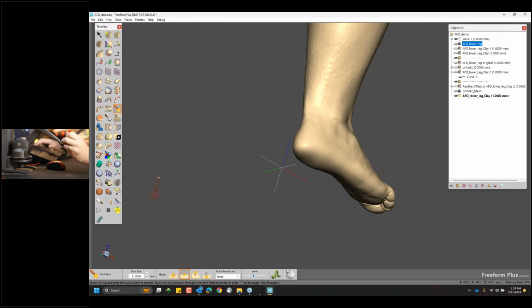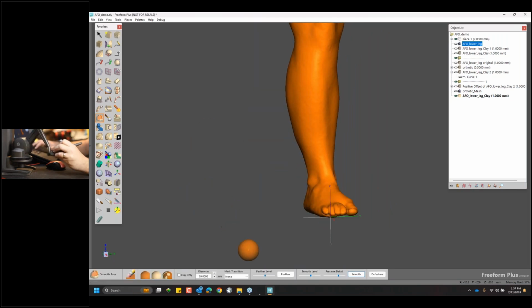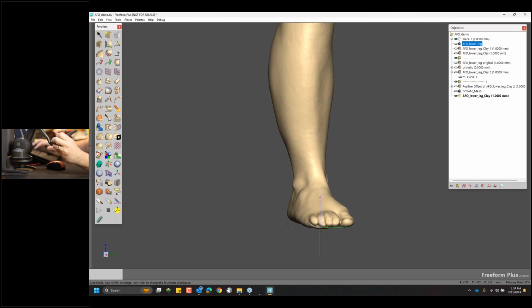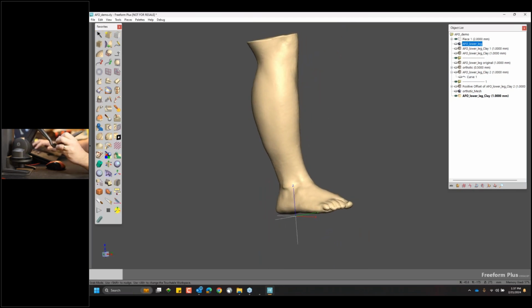I can clean up certain things, and I can also roughly apply an overall smoothing to it, especially because in this type of case, we're going to be building something that's sitting on the surface, and this here was an external scan, so it doesn't have to be precise to 1/100th of a millimeter. Removing a tiny bit of surface texture is not going to hurt.